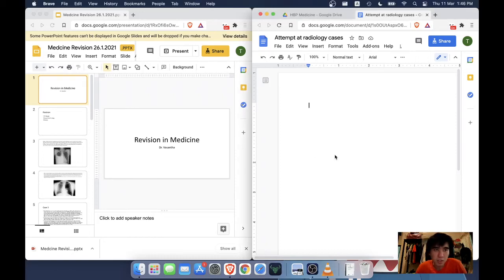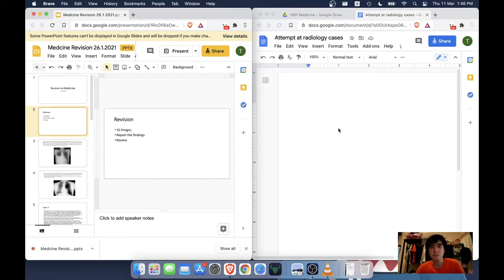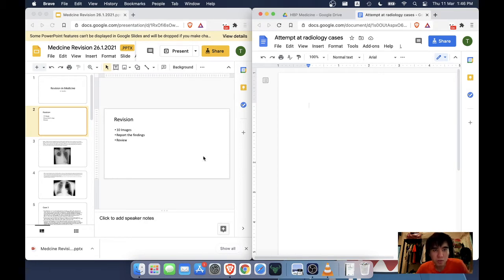Hello, so today we'll be attempting some radiology cases just before the class. So here it goes. Revision, so there are 10 images, report the findings and review.